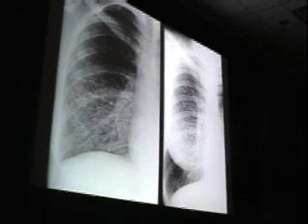On the CT, however, you can easily tell because EG tends to have thick-walled cystic changes. LAM has thin-walled cystic changes. So this is one of those places where CT really does make a difference. Makes it very easy to see, even though radiographically on the plain film it's impossible.